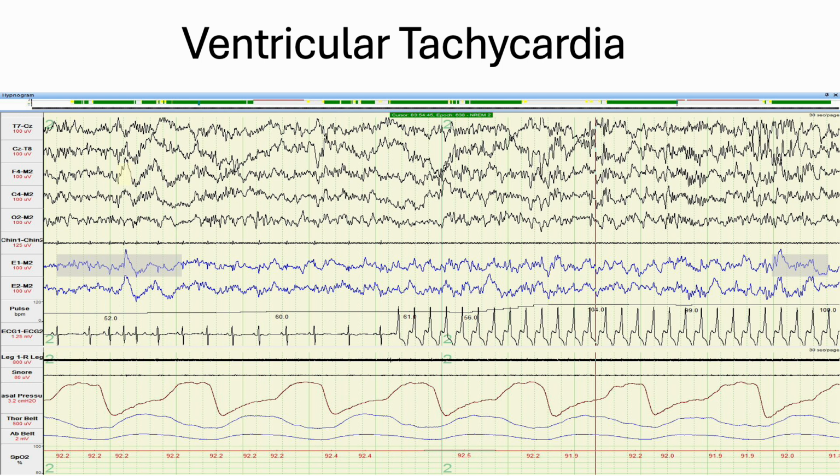And this is ventricular tachycardia, a potentially life-threatening heart rhythm. This is one that I ran. The only reason I didn't activate the emergency service was because the patient continued to have good readings on the pulse oximetry down here. I went and checked the peripheral pulse, and it was strong. If the patient is not responsive, you can't palpate a pulse, or the pulse oximeter is no longer giving you a signal, that's a good idea to try and wake up the patient.